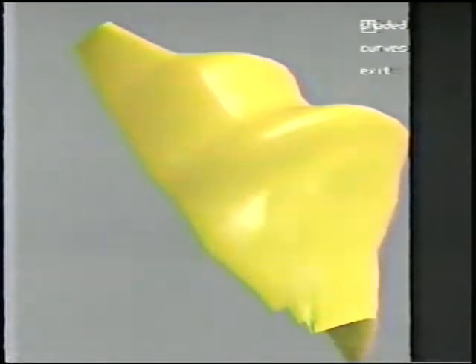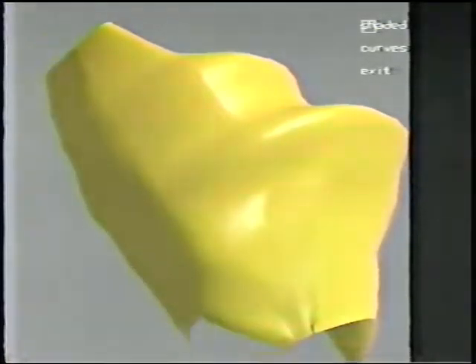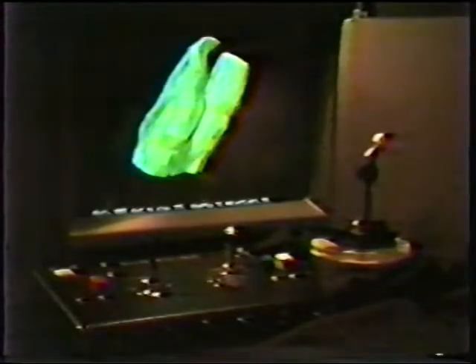Now let's take a look at some work done at the University of North Carolina, showing some additional uses for a high-performance display system with a programmable processor. The program by Greg Abram at UNC runs on an Adage Ikonas computer and frame buffer and uses the binary tree space partitioning algorithm by Fuchs, Kedem, and Naylor.